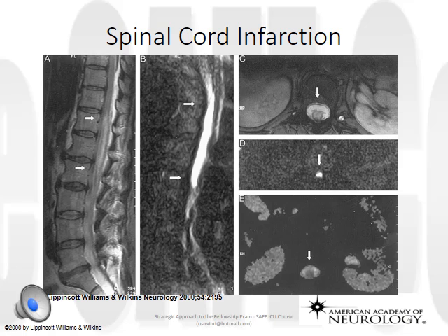Okay, so let's consider spinal cord infarction now. These images were taken 30 hours after symptom onset. A is the T2 weighted sagittal and C the T2 weighted transverse section. And you can see that there's onset of a hyperintense lesion with edematous expansion in the central portion of the lumbar cord and the conus medullaris. Diffusion weighted MRI demonstrates strong hyperintensity on the sagittal B and transverse D images, and so this is suggestive of ischemia.